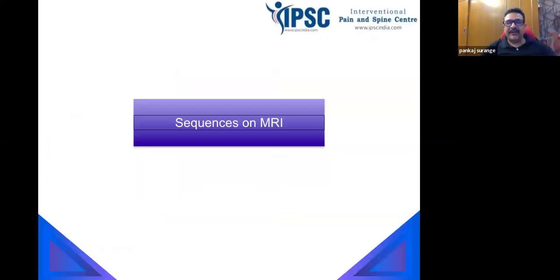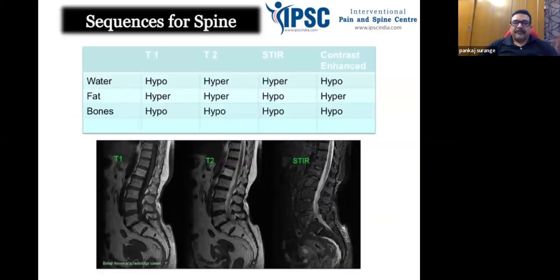Okay, now we'll try to understand what the sequences of MRI are. Okay, guys, clear so far? Any doubt?